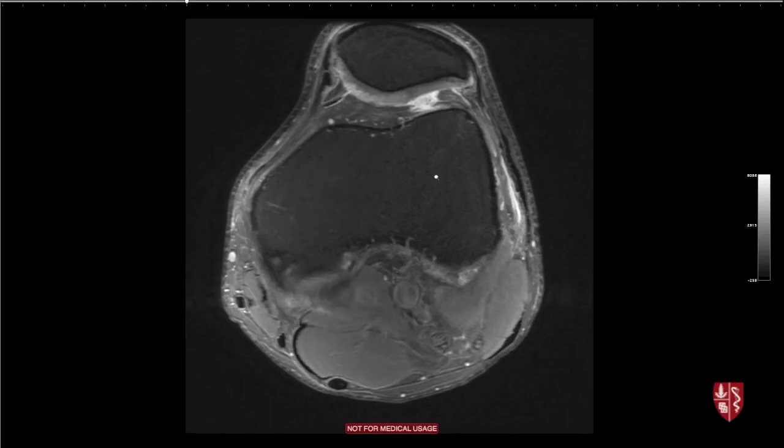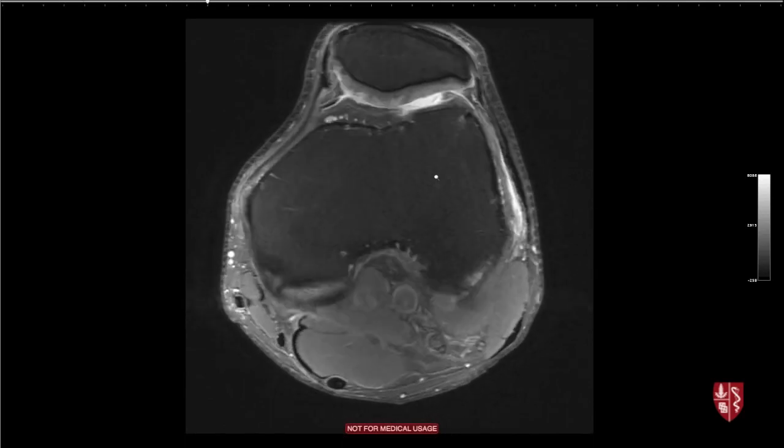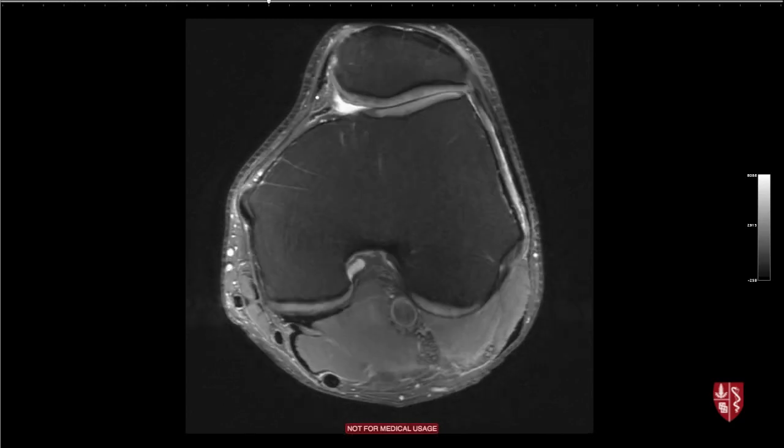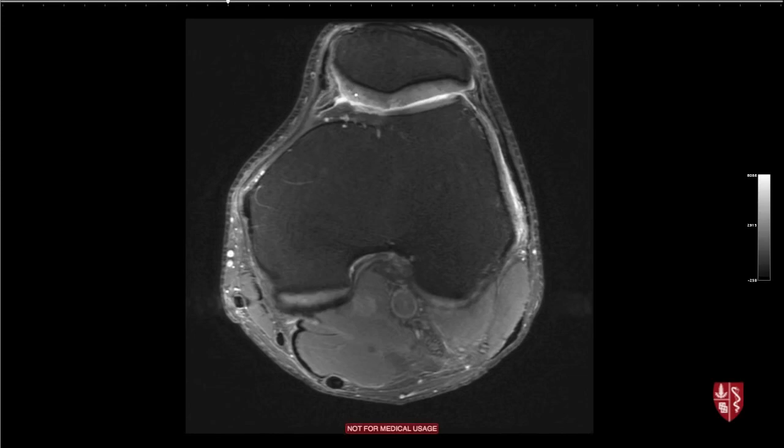Another good clue as far as medial and lateral goes is that the lateral patellar facet is longer. So this longer facet, that's going to be the lateral facet. Then here's the median ridge and the medial facet. Many people have a separate facet medially called the odd facet. So there's a little angle right here to here, odd facet, medial facet. We don't usually worry about distinguishing those two facets, but we talk about medial facet, median ridge, and lateral facet.